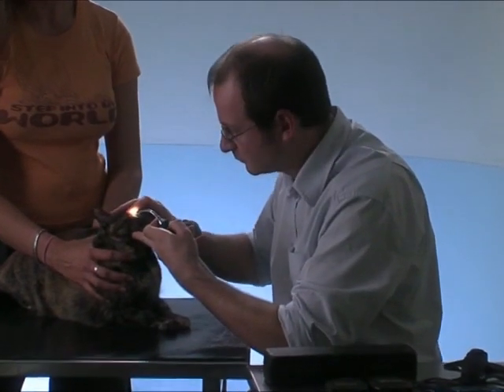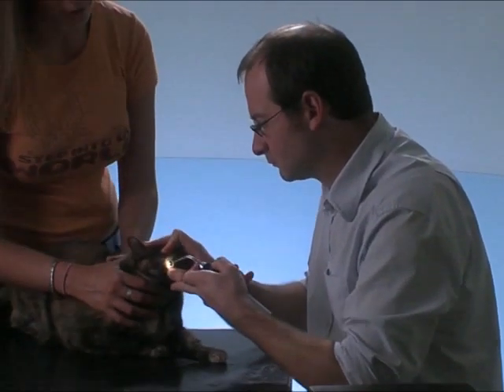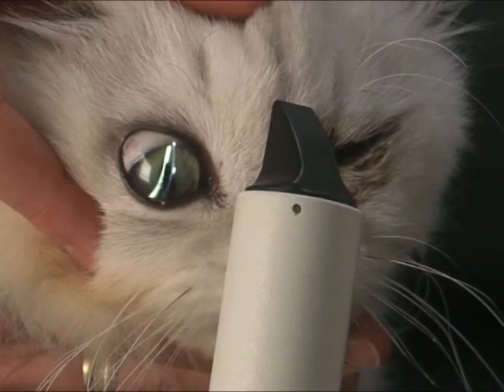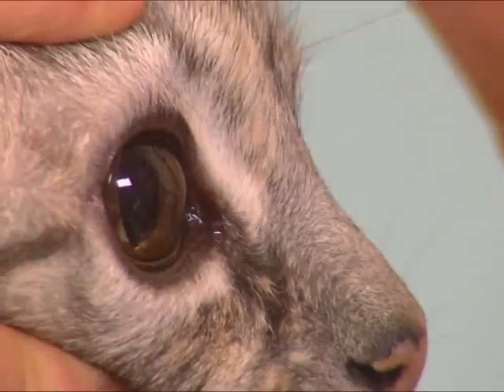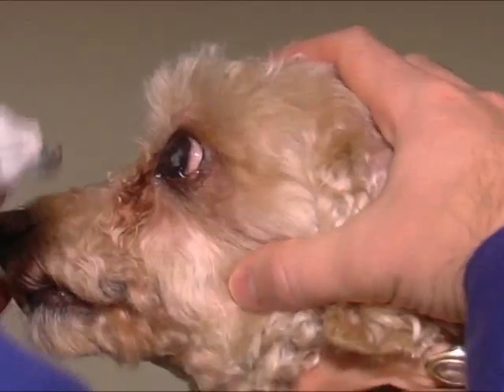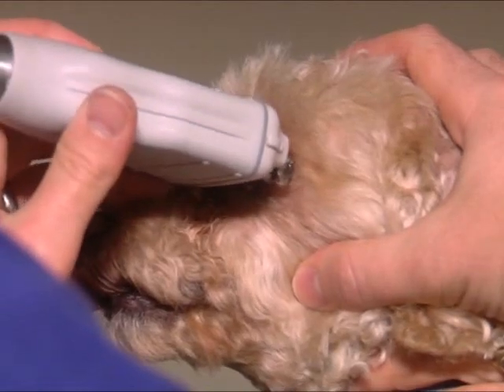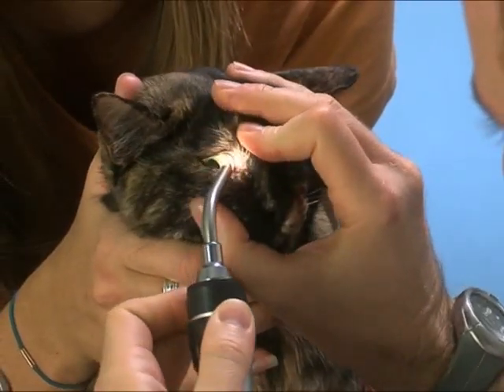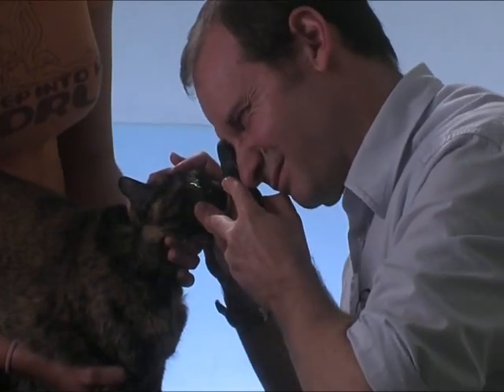Equipment available for ophthalmic examination ranges from the comparatively simple to the specialised and very costly. Specialised procedures are necessary in some cases for establishing a diagnosis. However, much can be achieved in general practice by careful use of a relatively basic set of equipment.